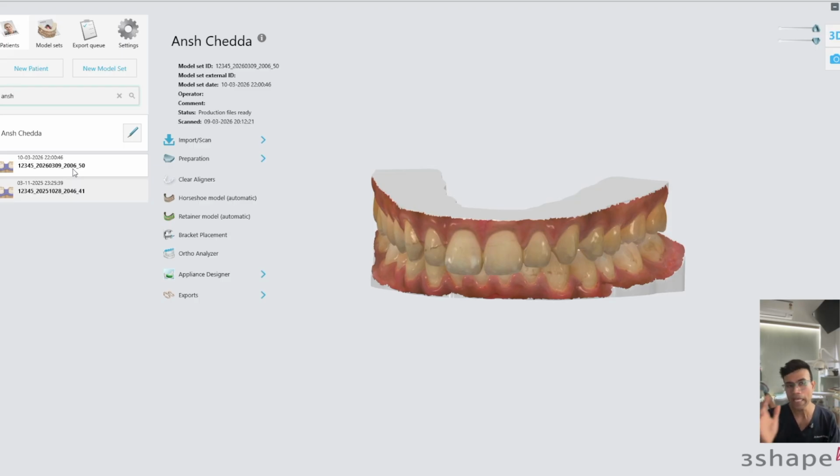If you have exported the plan, it will be imported by the other person with all the steps, all the models, and all the videos that you have created in the plan. All right, let's have a look at how we go about it.